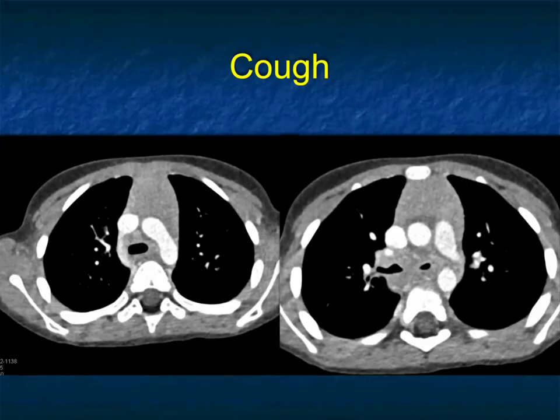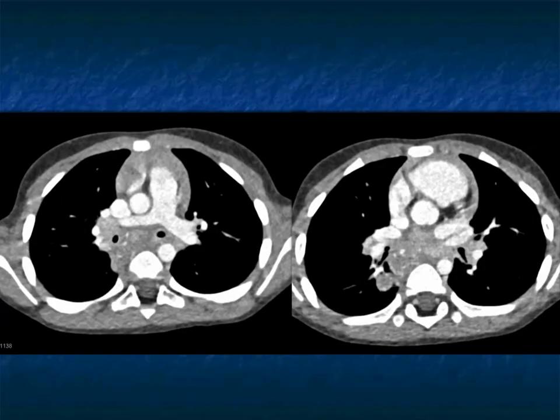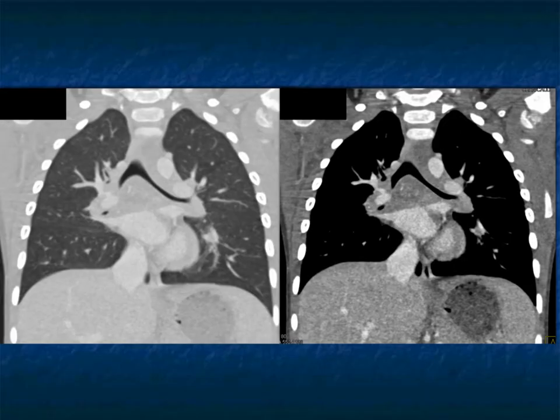Here's a patient who's 12 years old, and you can see a prominent thymus. But that thymus is normal for age, right? The patient's 12. The patient does have adenopathy, pretracheal zone and around the trachea, middle mediastinum and posterior mediastinum. And these look like nodes in part calcified. There are also hilar nodes. You can see the compression of the bronchi by the subcarinal nodes.